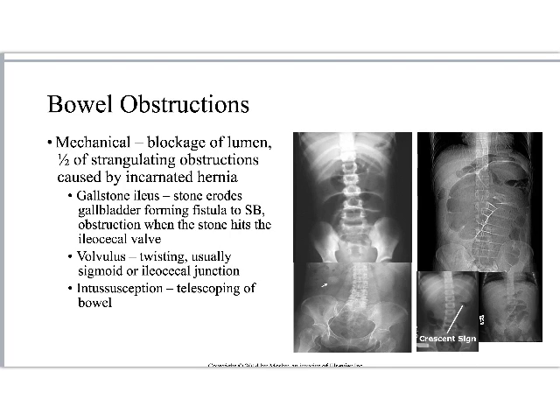Has anyone seen those procedures? Like you're doing a dual contrast barium enema, diagnose intussusception, and also potentially treat it. Because just like with a telescope, if it's telescoped and we push enough barium through it, maybe that will untelescope it, right? Now we don't have the intussusception there. So the important thing to note on all these pictures is there's a lot of air going on here, right? I've said it's an obstruction. In my mind, if the bowel is obstructed, it should be full of crap, right? It's not. It's full of air. The crap is what caused the obstruction, and now it's just filling up with air.